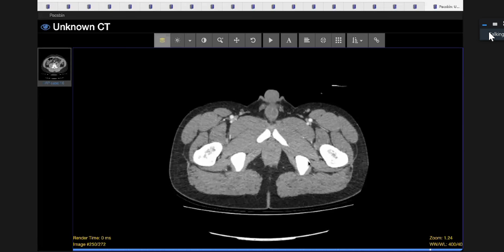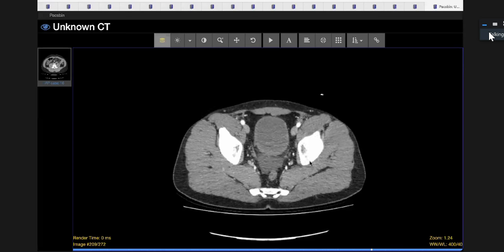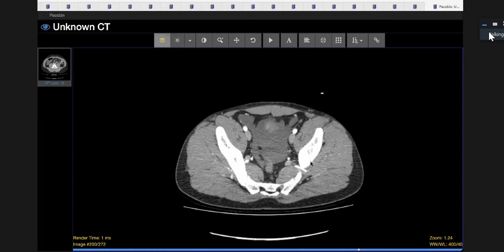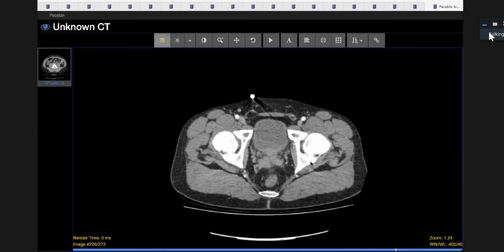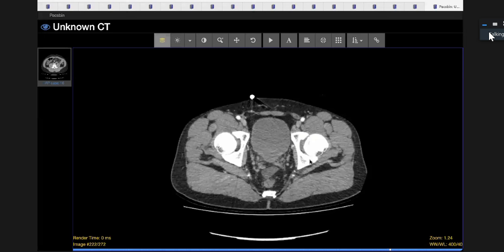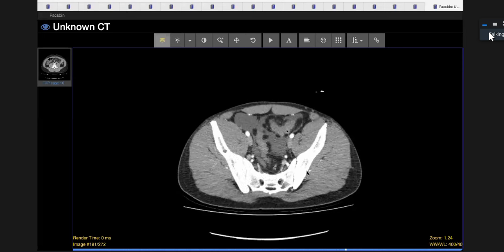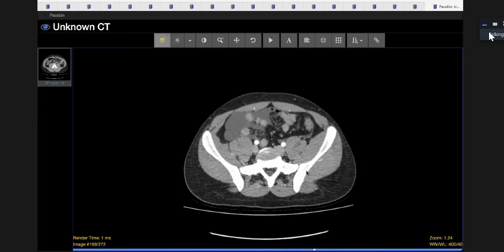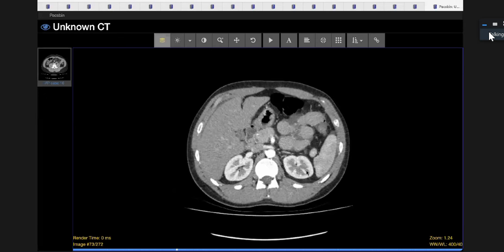Now the bladder. So I would like to see. I don't think it's particularly enhancing, and I don't even think the contents are hyperdense. But what I'm trying to get you to say is that bladder injuries can be occult, can't they, on the initial CT? So what would you do next?